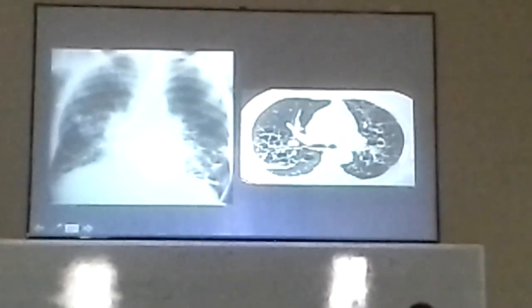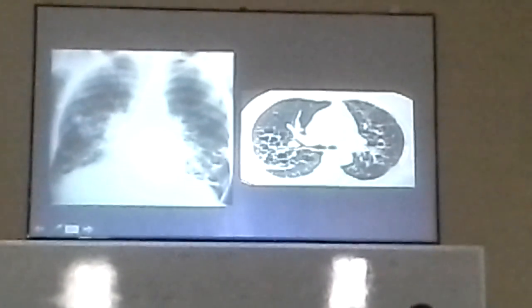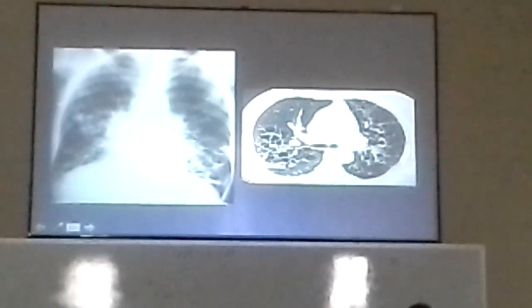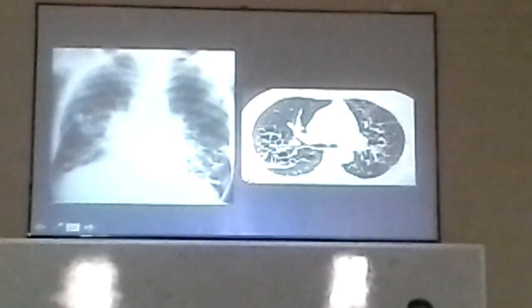Yes, if you see tubular and cystic shadows in the lung, and if you do CT scan and you see this cystic dilatation like this. So what is your diagnosis? Bronchiectasis. This is typical appearances of bronchiectasis, dilatation of bronchi. And I told you this is the bronchus and this is the pulmonary artery vessel. So it is more than the vessel size. If it is more than the vessel size, then this is diagnostic of bronchiectasis. Again, there are many causes of bronchiectasis. So for you to remember only bronchiectasis.